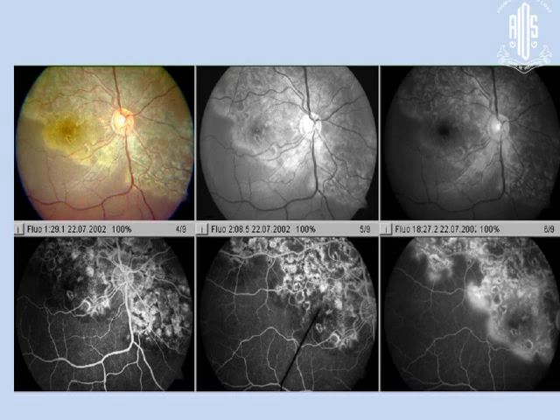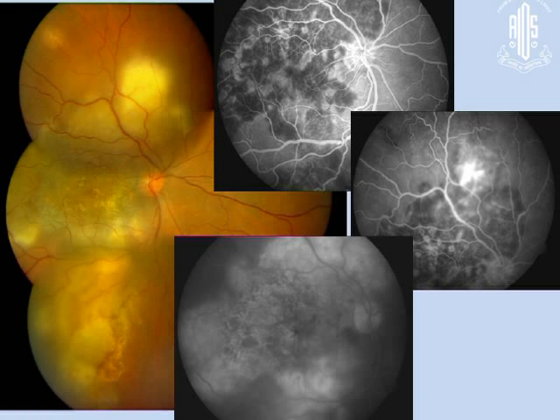Whereas you go back and see the lesion which is behind that, this is basically a lesion which is scarred, which is very well delineated, not blurred. And if you see the hyper initially and later on it remains hyper, more hyper, doesn't matter, but this hypo turning into hyper is the clue here that we are seeing an active lesion which is corroborating with the clinical findings there. Similarly, this eye is also full of findings.